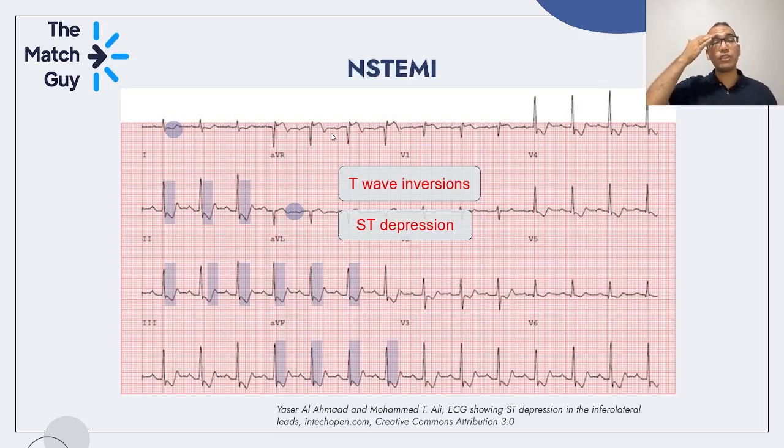Now guys, based on what we just discussed, I want you to tell me which part is affected, which leads are affected, and which artery is affected.